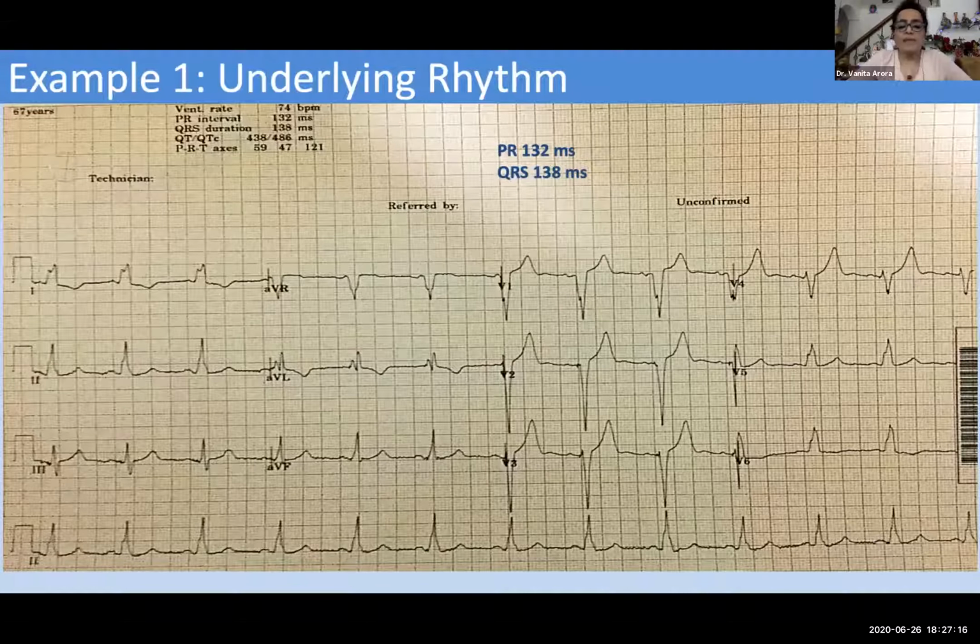So I will just discuss a couple of examples with you whereby we have done the programming and made the patient's parameters better. This is the ECG. You are seeing the baseline ECG of the patient. If you see, the QRS width is around 140 milliseconds. There is some notching on lead 1 and even on lead V5, V6. The PR interval is short and it is normal.